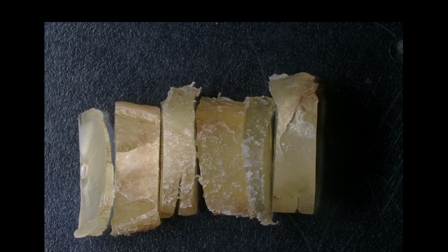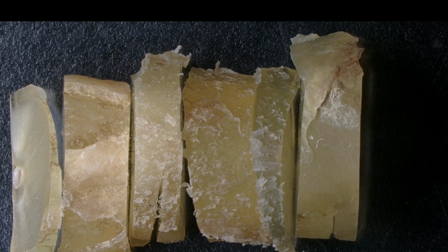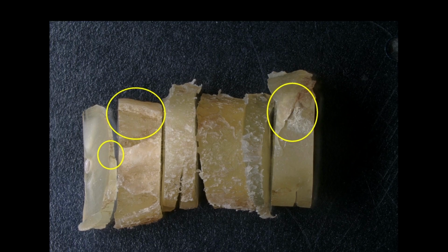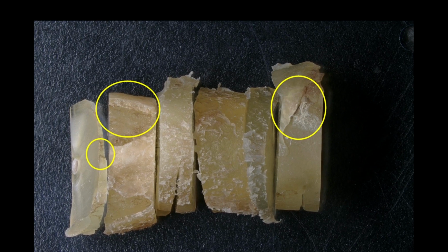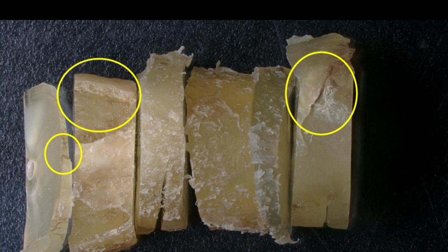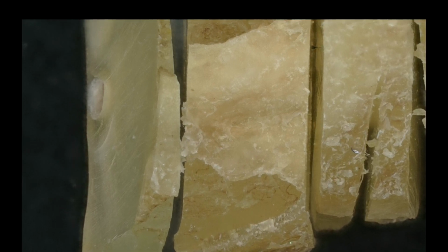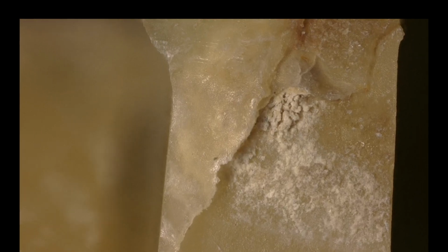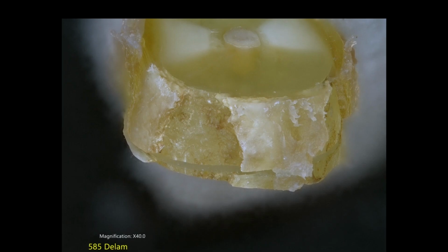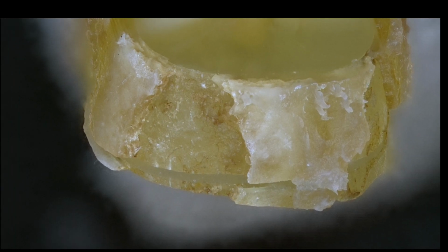Then I took the tooth in the coronal side, I sectioned it axially, horizontally, and decided to look edge on at some of the delaminated area, hoping to find some information on what could be the cause of it or contributing to the cause of it. We didn't have much luck really in learning anything about the etiology of the delamination by looking at this, but I thought I would try. And then I'm taking some pictures of what the delamination areas look like.